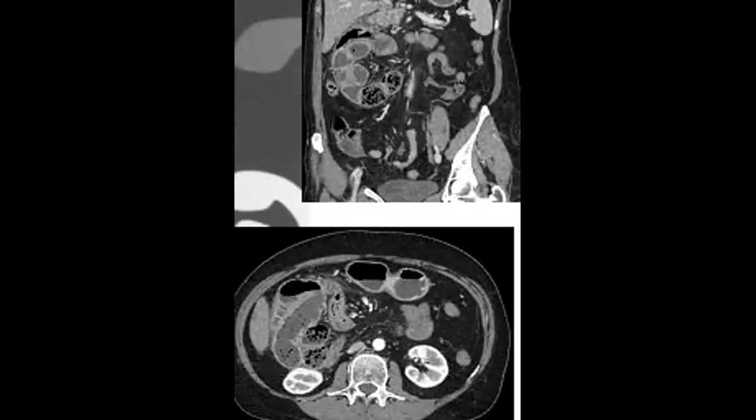Because if you find abnormal location in a patient with bowel obstruction, and abnormal location between the artery and vein, maybe you can think that it could be one of the types of internal hernia as well. And this is again one of the exam questions.